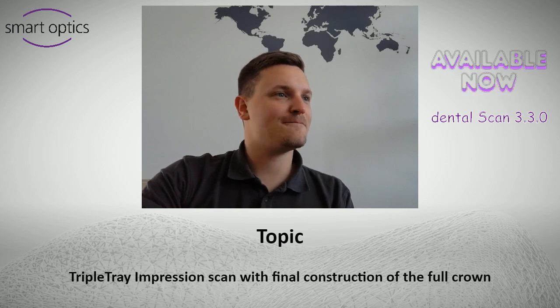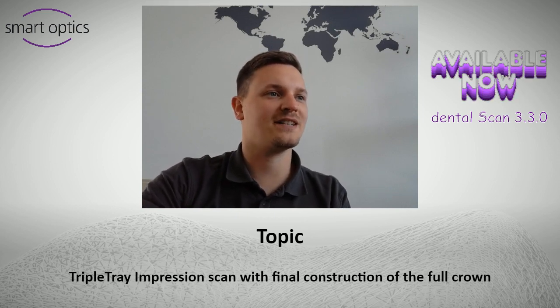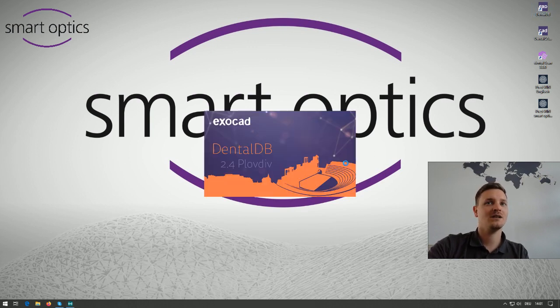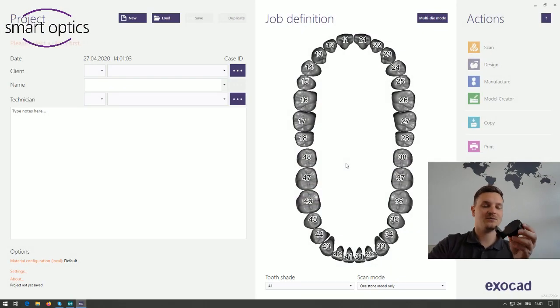Great, so let's start with the presentation. First of all, we will do the project there in the Dental DB. And things that we need are, of course, the TripleTray or the impression holder.